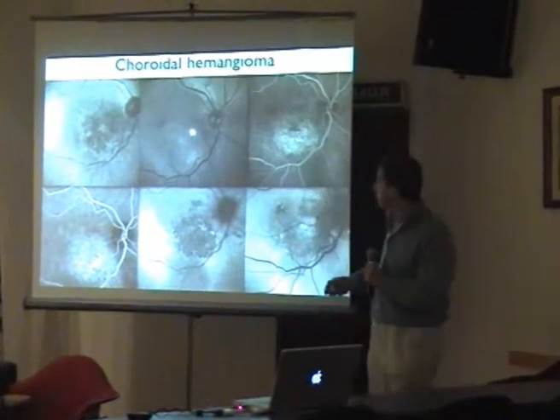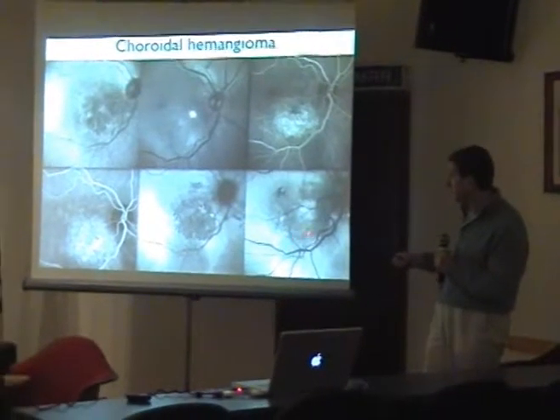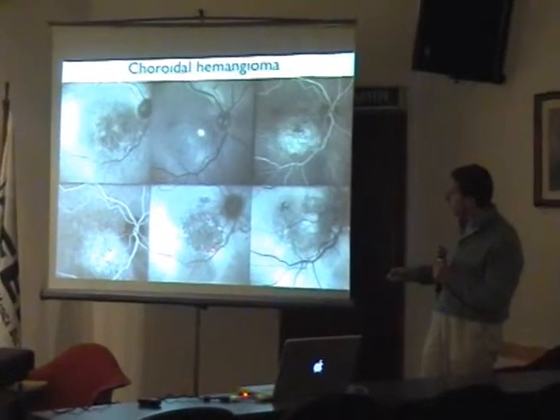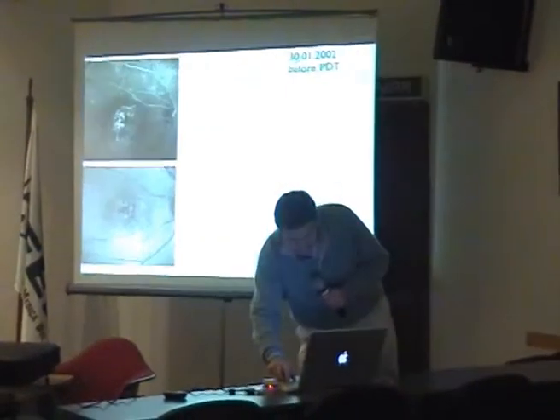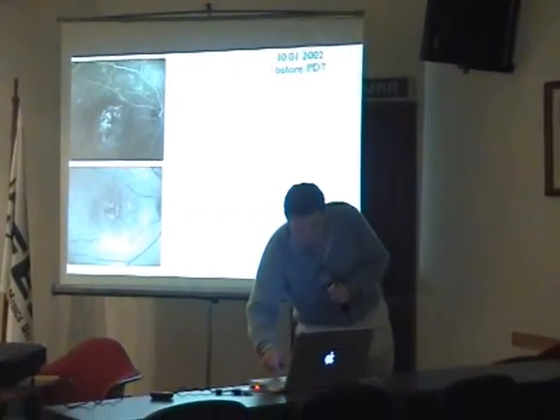The choroidal hemangioma, you see here, this is a late ICG and autofluorescence. And this is another interesting thing.